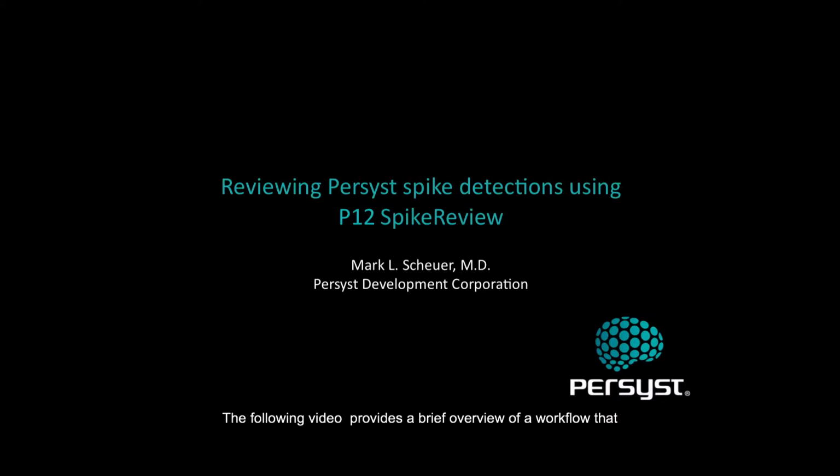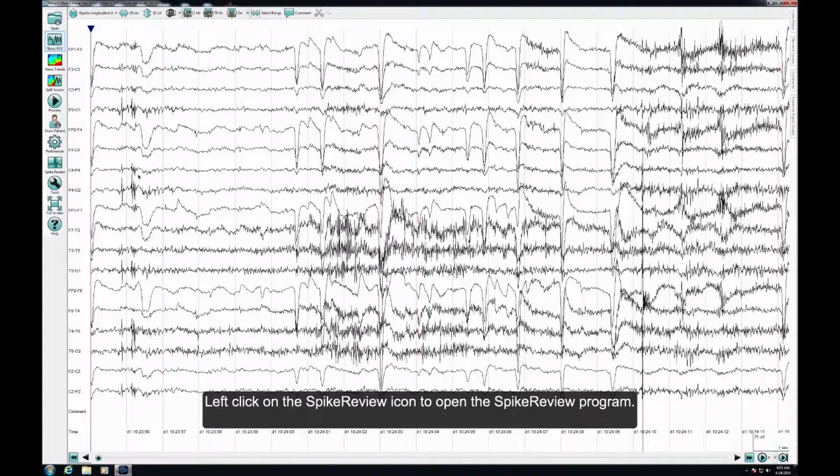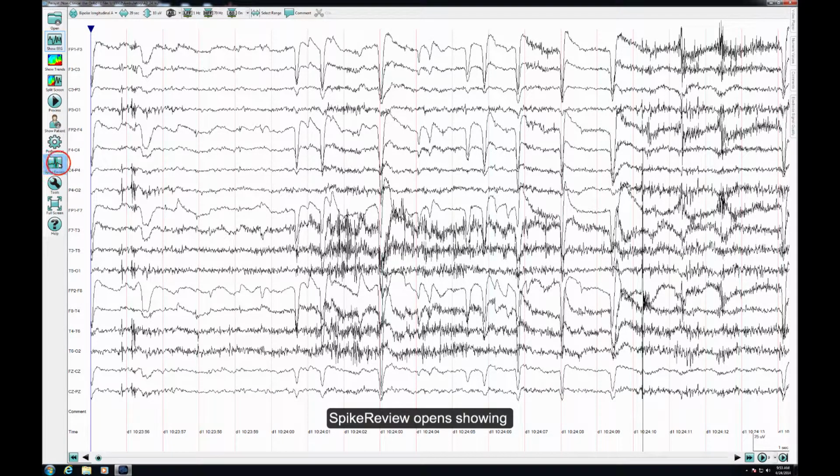The following video provides a brief overview of a workflow that many clinicians find useful for evaluating the spike and sharp wave detections marked by Persyst's P12 spike detection algorithm. Left-click on the SpikeReview icon to open the SpikeReview program.